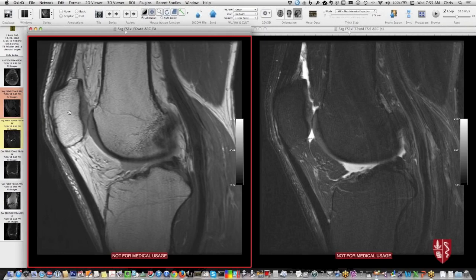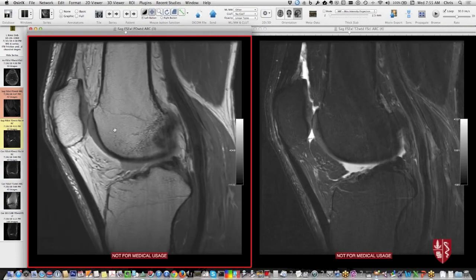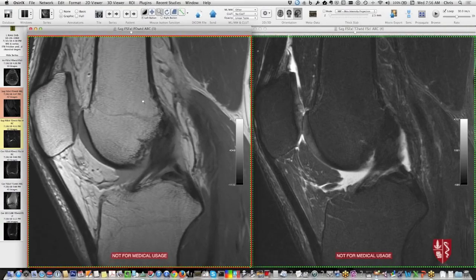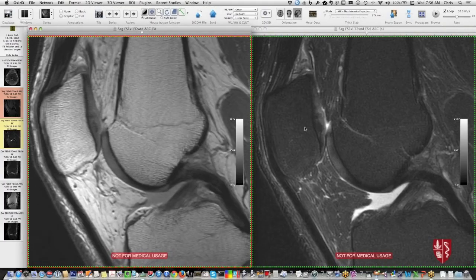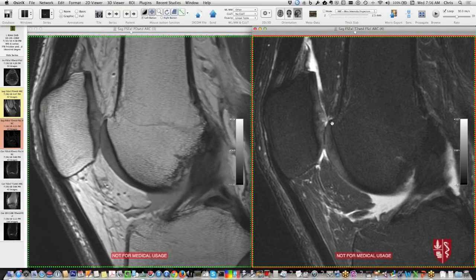And then it's really important to look at the articular cartilage of the patella, and maybe even more importantly, the trochlea. So here, this gray along here is the femoral trochlea that articulates with the patellar cartilage. If I zoom in on that and move it a little bit, the patellar cartilage is a little bit abnormal here. It's got a little bit of heterogeneity in it right here, a little bit of low signal there. So some minor surface irregularity, and you kind of have to scroll again on these fluid sensitive sequences. You can see the surface pretty well.